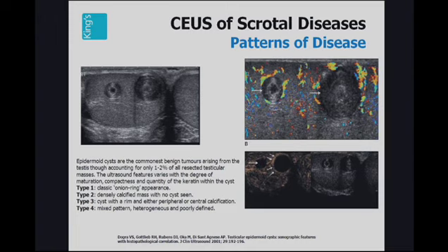However, there are other types: densely calcified, calcified cyst, or just a mixed heterogeneous poorly defined abnormality. The key to the diagnosis is the complete absence of vascularity. An epidermoid cyst is a true cyst containing caseating material. The color Doppler ultrasound is usually very good at showing that there is no vascularity, but the addition of contrast to the examination allows greater confidence in interpretation.